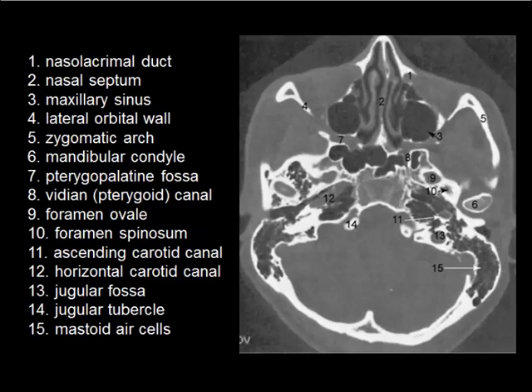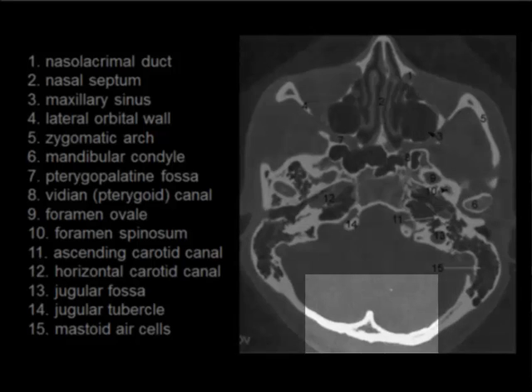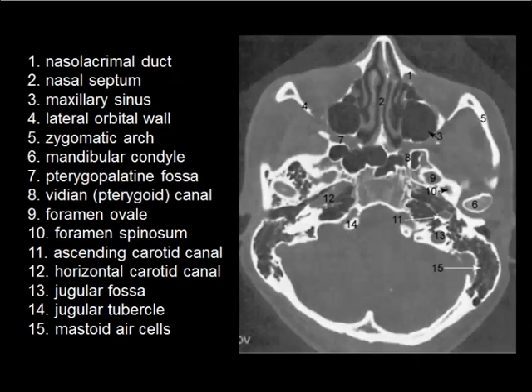One of the structures not labeled in this particular image is at the bottom. It's the internal occipital protuberance. It is seen pointing towards the interior of the skull. But again, spend some time and go over the other 15 identified parts.